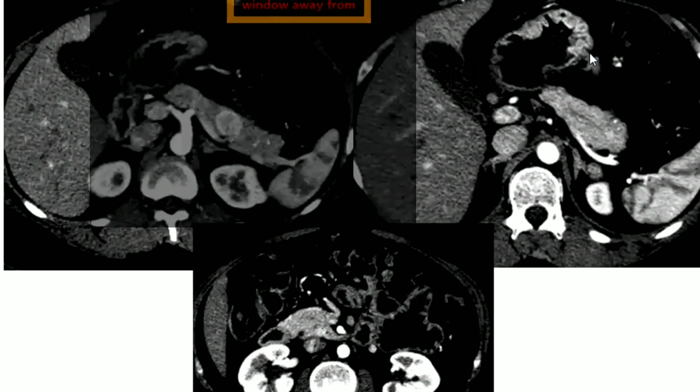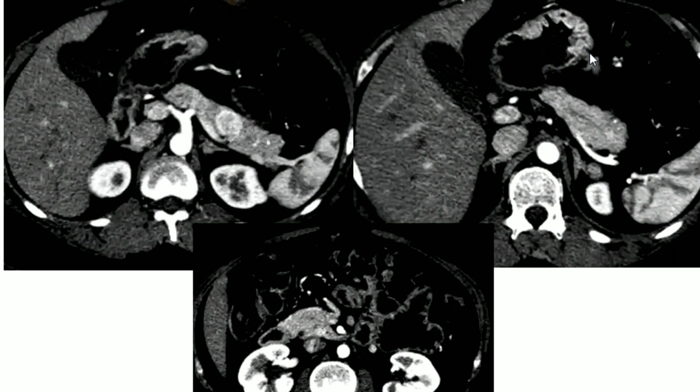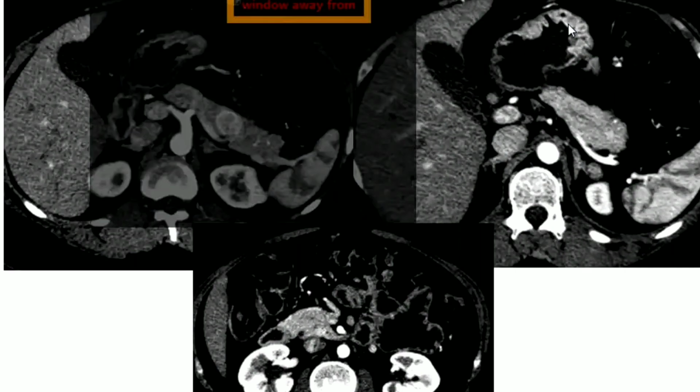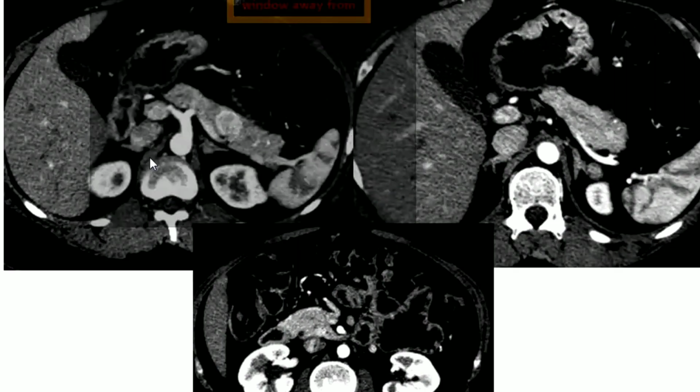Yes. That means the patient is going on with Zollinger-Ellison syndrome. So this is excellent. The gastrinoma. Excellent. So we have hyper-enhancement at the mucosa of the stomach, and it means gastritis, and this solid pancreatic lesion, gastrinoma most likely, and in gastrinoma we have high gastrin level, which leads to increased gastric acid and diarrhea, gastritis, severe gastroesophageal reflux.